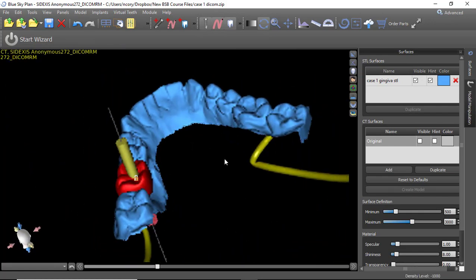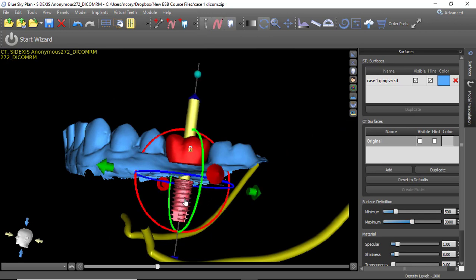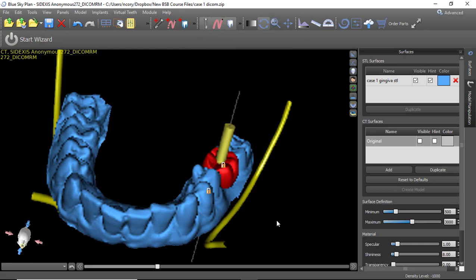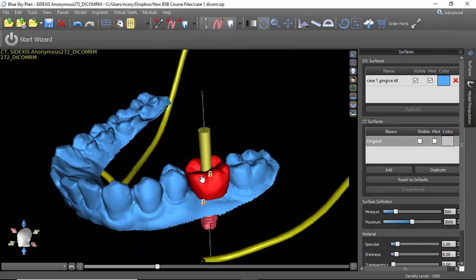And at this point, we are ready to make the guide. I'm going to right-click the implant and lock it, again, just so I don't knock it out of position. And so before I make my guide, first thing I want to do is turn off the tooth, okay? So you've got your plus implant nerve and tooth up here, but then you've also got just these buttons without the plus sign. If I was to click these, those just turn on and off the visibility of the implant's nerves or teeth. I'm going to turn off the tooth.